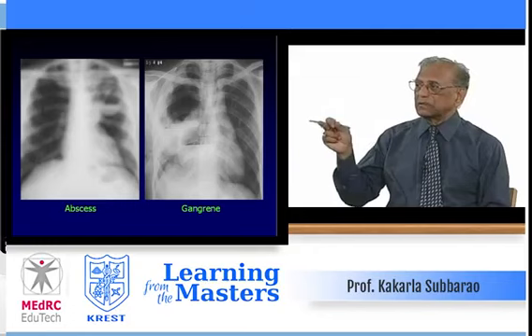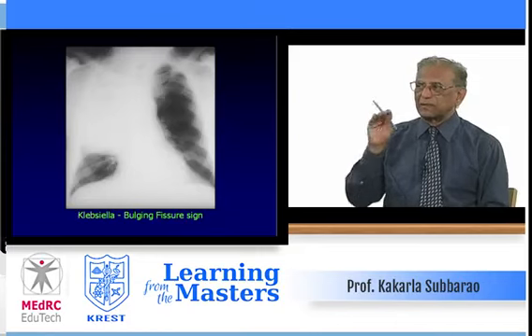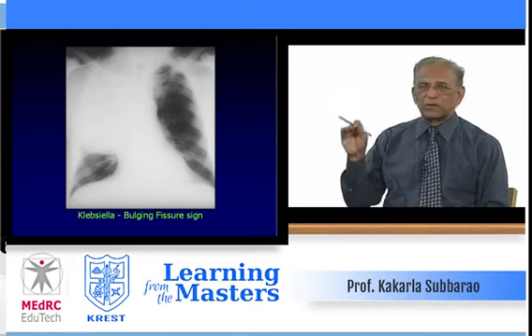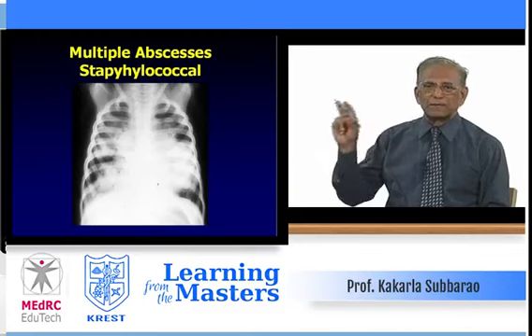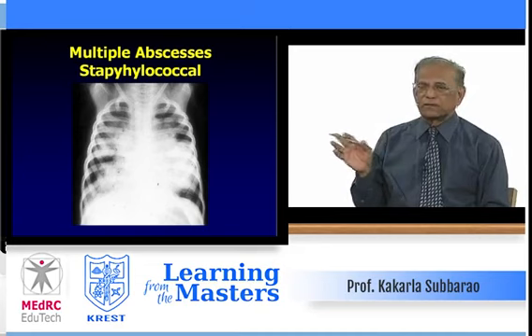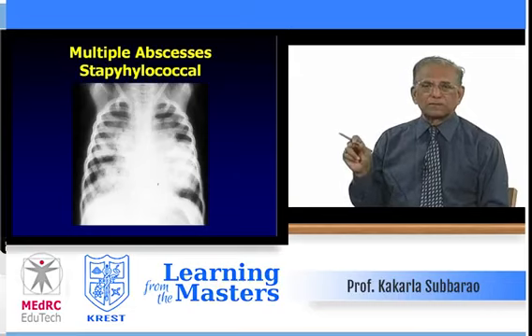And then multiple abscesses are restricted to the right lung. This is also consolidation in the right upper lobe. It's not atelectasis. But then the transverse fissure is bulged low below the right hilum. This is what is called bulging fissure sign, often seen in staphylococcal pneumonia in children or Klebsiella in adults. Actually, patchy areas of pneumonitis, consolidation in both lungs, you can call it bronchopneumonia, but in certain films there is central necrosis, multiple abscesses in staphylococcal.